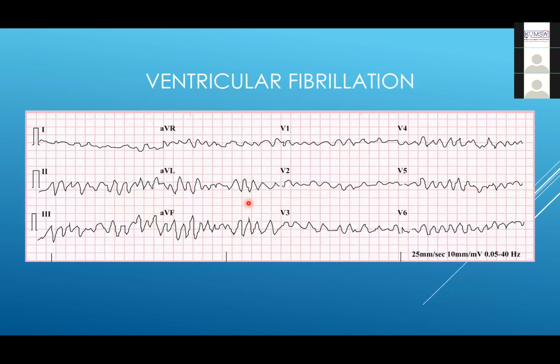And this is ventricular fibrillation. If you're seeing this on the monitor, your patient is dead, so you have to resuscitate him. You have to make sure that he's awake first. If he's awake and you see this, there's something wrong with the ECG. But if you see this in an unconscious patient, you know for sure that this is ventricular fibrillation. There's no pattern at all to the electrical activity, and this patient needs to be shocked.